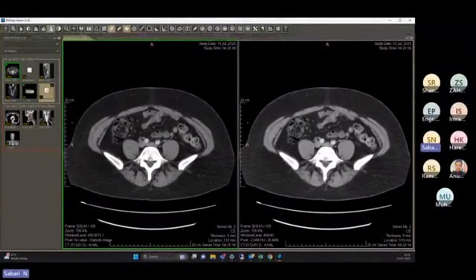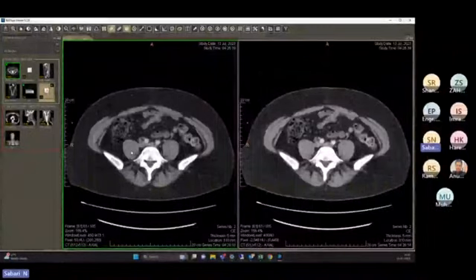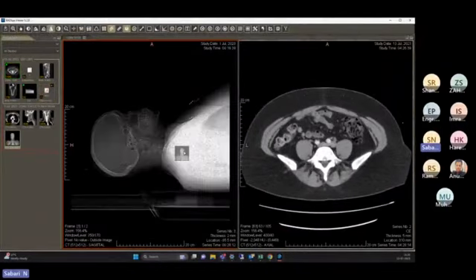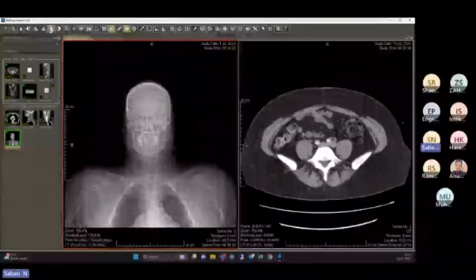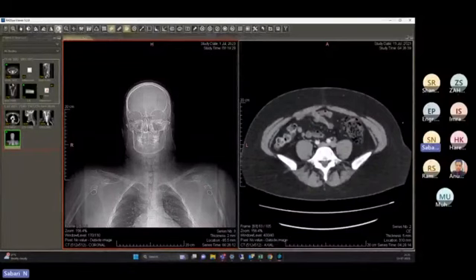And flipping the images. When we are doing the X-rays, the technician sometimes flips the images and pushes them to the PACS. But when doing the report, the radiologist cannot report with a flipped image, right? So he himself can correct the image. Yeah, we can see this image. When I do a flip, we can see left to right and right to left. Based on that, they cannot do the findings clearly, so they can flip it here itself.